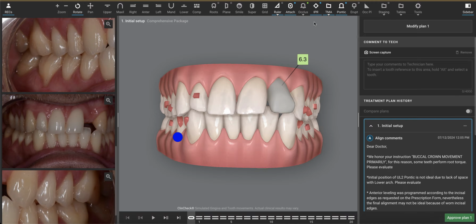The challenge that we have right now, at least in our market, is the periodontists are booking out almost a year. And as a result, patients are motivated, they want to get stuff done. So we're kind of left with the bag when it comes to decision making on patients like this. So I'm going to build into this plan the fact that the periodontist won't see the patient until after the orthodontics is completed.